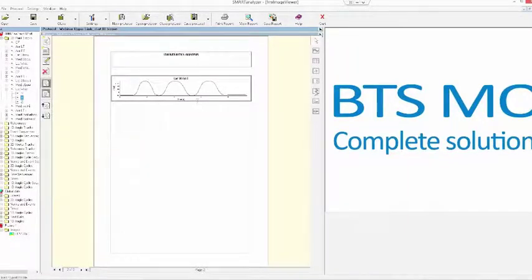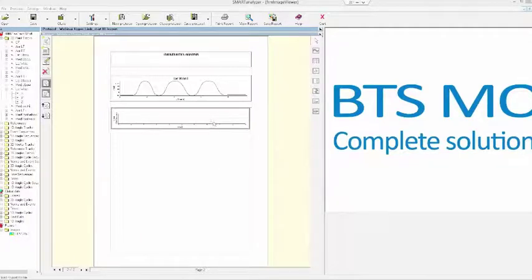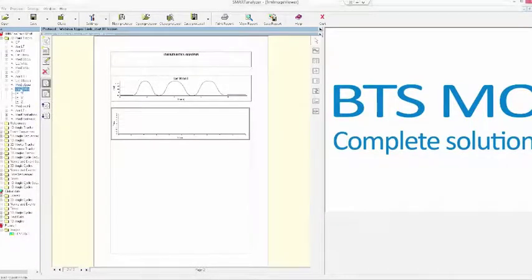Okay, so what is instead a cyclogram? Let me just show you. Okay, so I can create a second box. Imagine that I want to plot the same variable, but now I will choose plot y versus x.